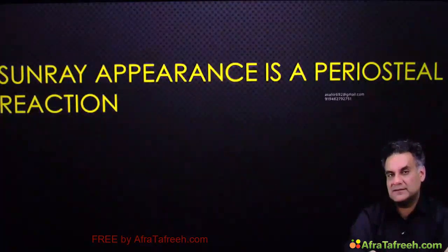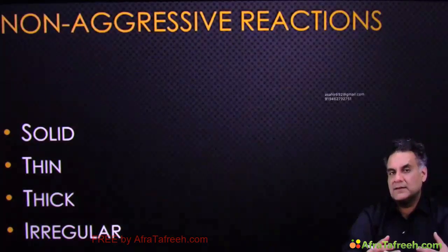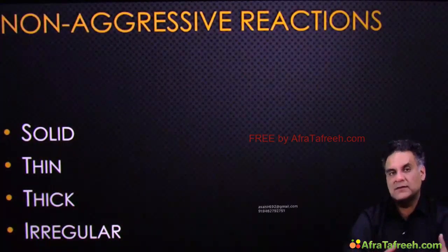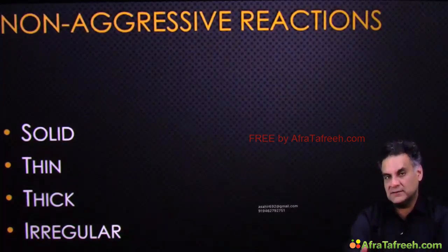Sun ray appearance is a periosteal reaction. It's a controversial point. Do remember. These wide zones are also called aggressive lesions, and narrow zones are non-aggressive lesions: solid, thin, thick or irregular reactions.